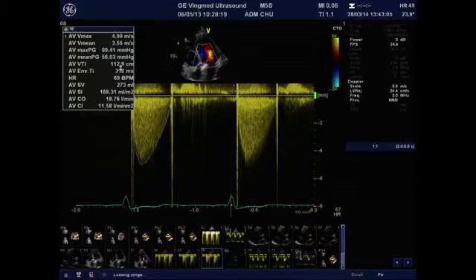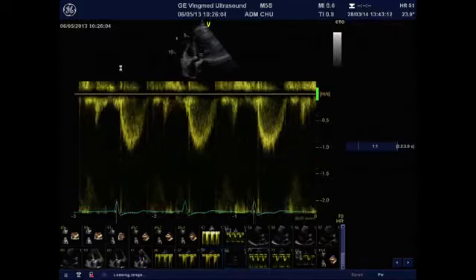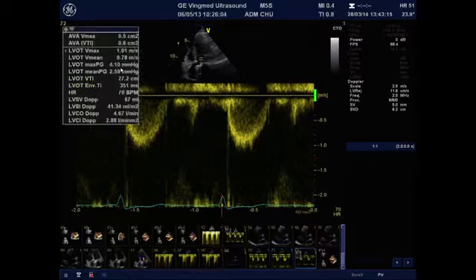If you move on to calculate the effective valve area using the LVOT diameter and the LVOT VTI, you obtain an aortic valve area of 0.6, which is much smaller than what you should expect for that kind of prosthesis. So clearly there's something going on in that prosthesis and you should suspect a dysfunction.